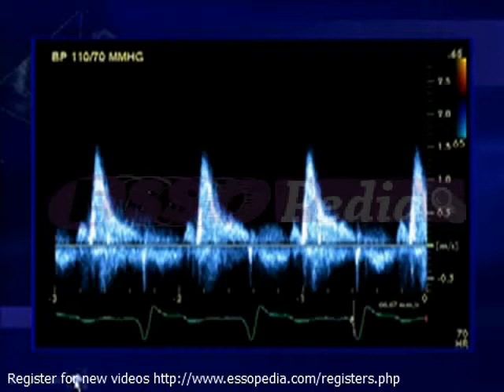One must question whether this is secondary to MAC and some obstruction to mitral inflow, or if LV filling pressure is increased. Now, the relatively short isovolumic relaxation time and deceleration time would suggest that these findings are largely related to an elevation in LV filling pressure.